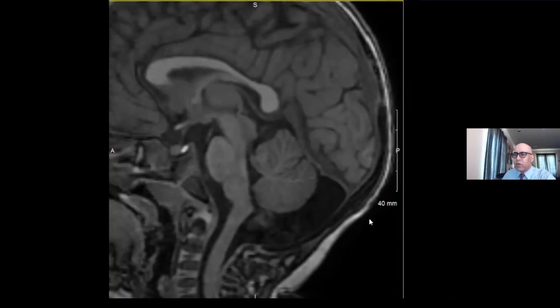This is an MRI of the brain in a 2-year-old child being performed for seizure. Fortunately, the brain was normal and didn't show any abnormalities that would commonly be associated with causation of seizures. However, one area that was puzzling was the appearance of the posterior cranial fossa. At an outside institution, this was referred to as a Dandy-Walker malformation.